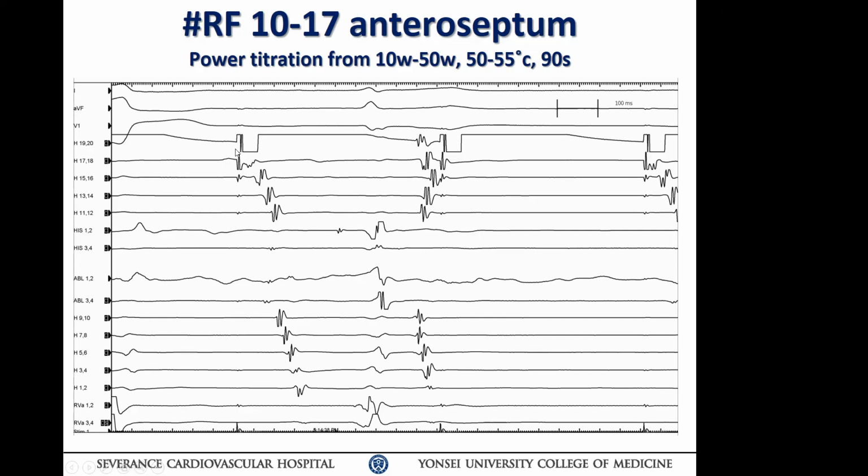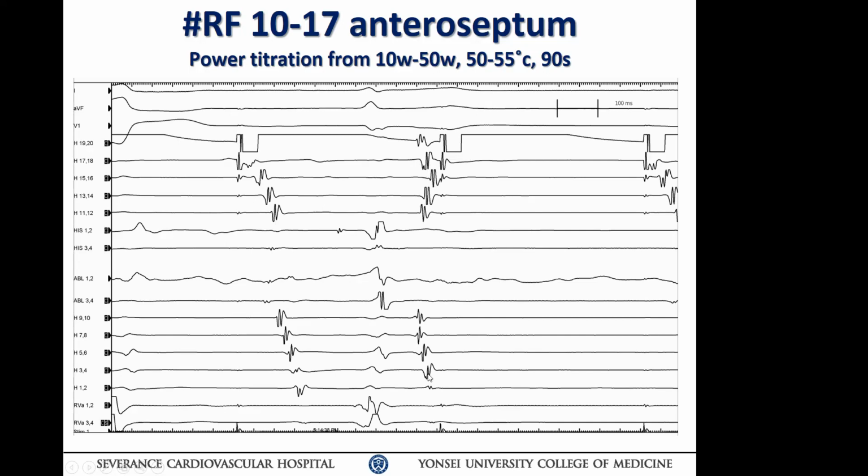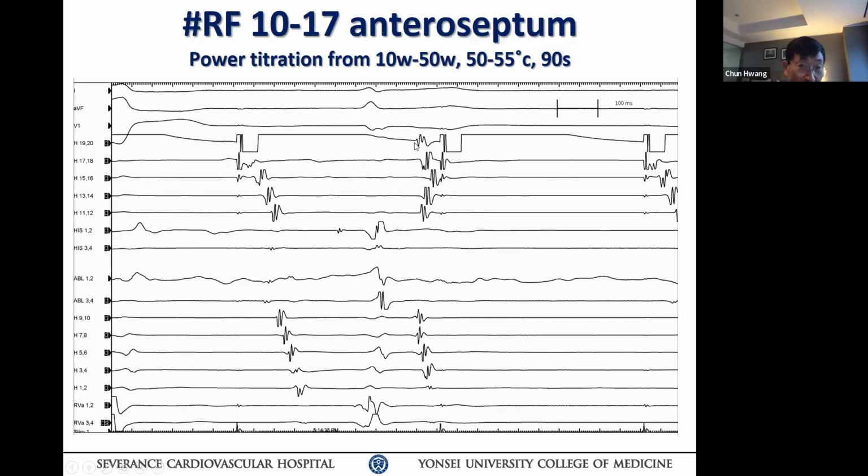Yeah, pacing atrium. Did the atrium capture? Looks like no. What happened here? Is that an echo beat? What do you see here? This beat here. Is it another junctional beat? Looks like echo. Echo or junctional? You can tell. So what do you do?